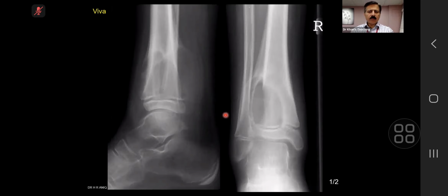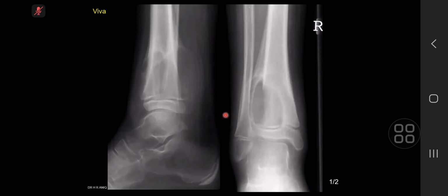Okay, I am happy with your thinking of an aggressive lesion, so I'm very happy with that. But why Ewing's and why lymphoma? It is a cystic lesion, isn't it? Yeah, just thinking about because it's quite aggressive, and I was thinking what aggressive lesions would I expect for someone that age. It isn't osteoid, which makes me think it's less likely to be an osteosarcoma.